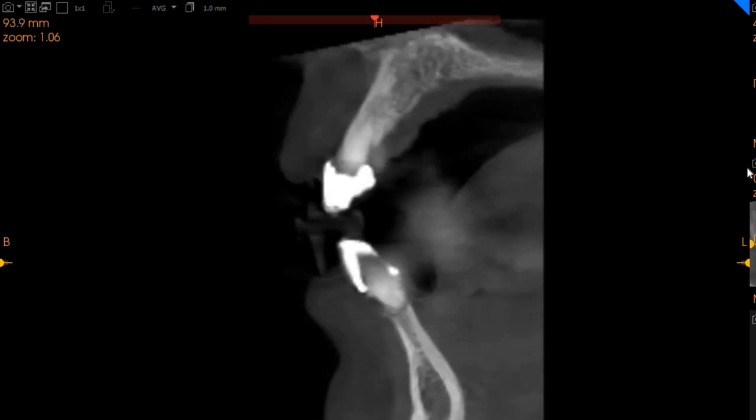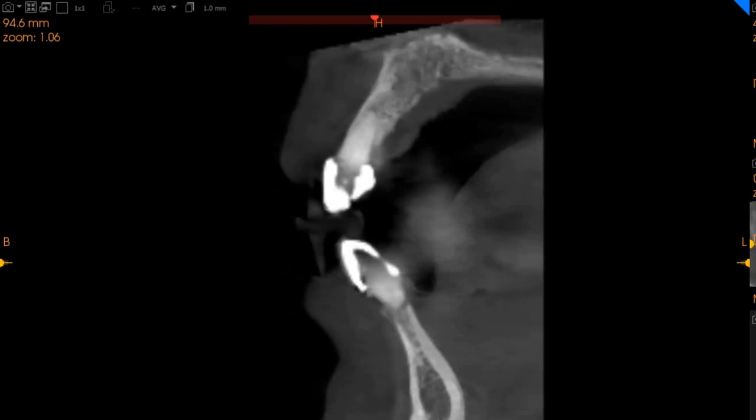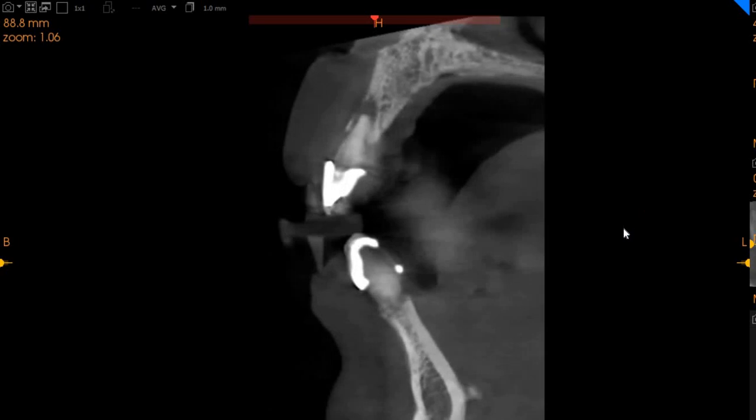Moving to the central incisor region, central incisor is periodontally compromised. We've got approximately 6 millimeters of bone width with 20 millimeters of height in this region. This is the central incisor of the upper right quadrant. Very periodontally compromised, perforations in the cortical plate, approximately 7 millimeters of width with 20 of height. But again, the bone quality in this region is compromised due to the periapical infection.